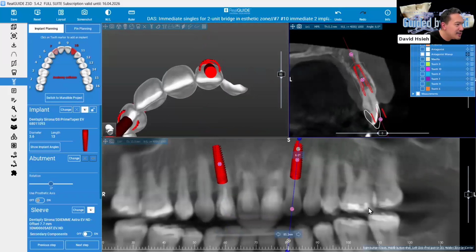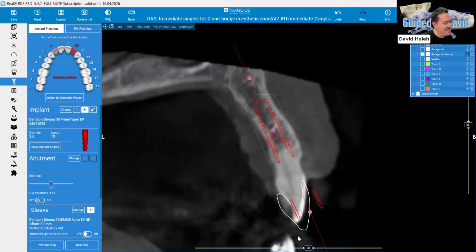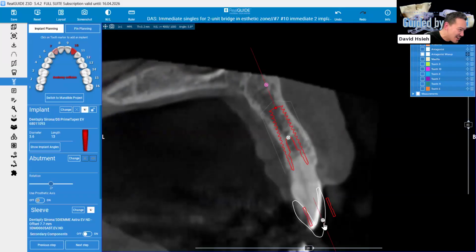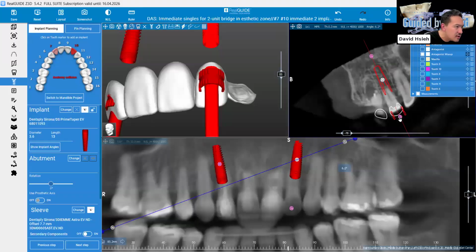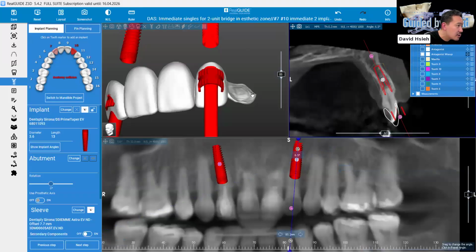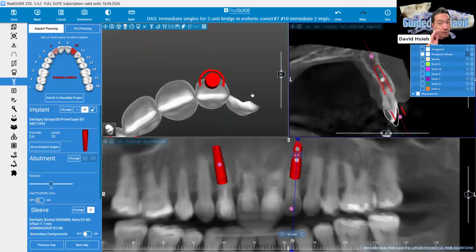Okay, and here we know this is more challenging. This is what it is, right? You can try to push your boundary, and sometimes it just doesn't work. So we know right from here. Okay, we rotate around. Are we good in 3-dimensional? Everywhere. I think we're almost there. Okay, so the struggle: if you use a straight implant, it's going to blow out from the facial for sure.